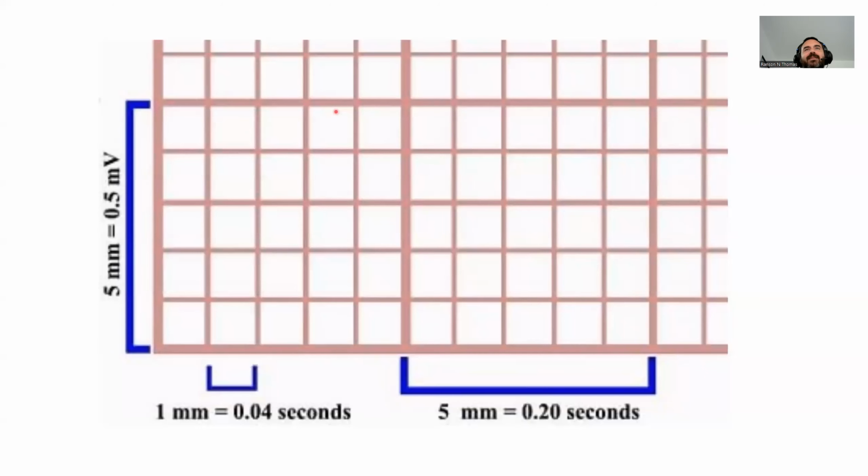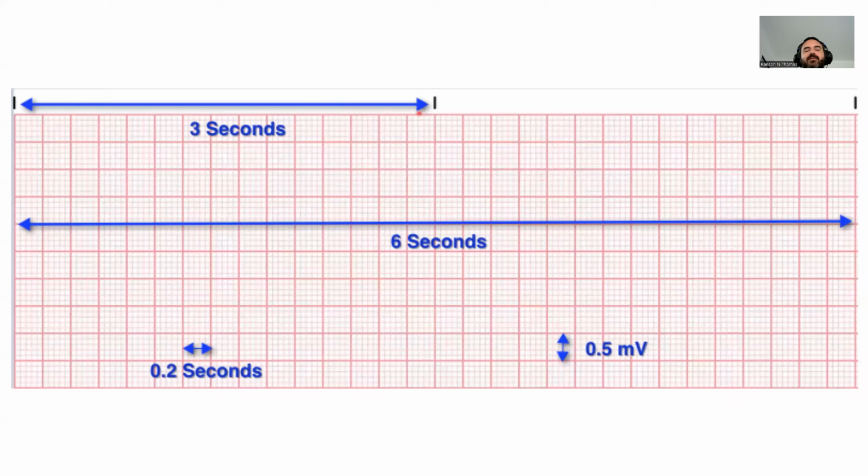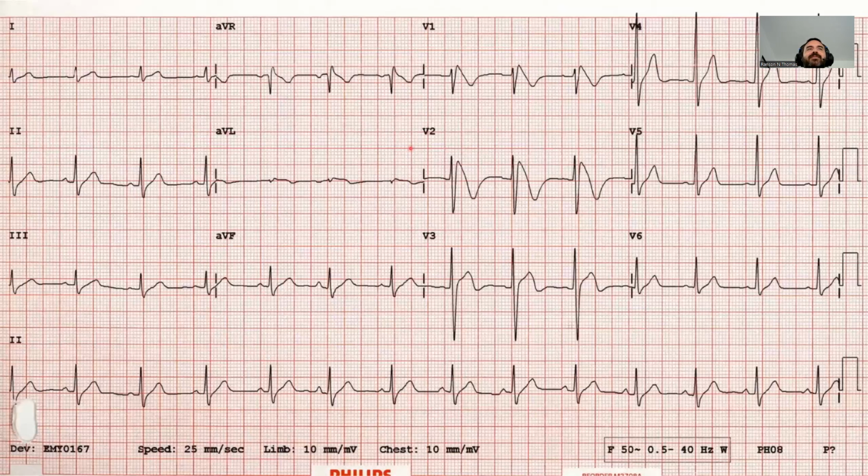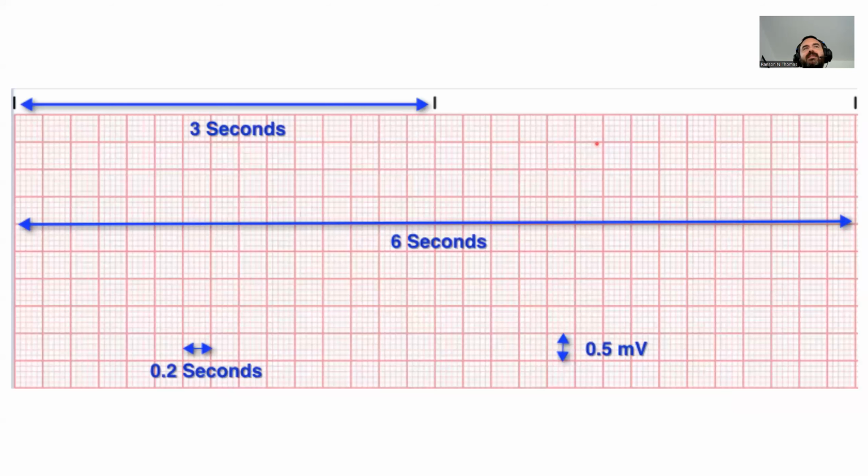We just went from this, which is pretty easy because there are no rhythms, to now we've got a dozen or more rhythms on the screen. So what are we looking at here? This is a single rhythm strip, right? What you're likely going to see is a single rhythm going on here.